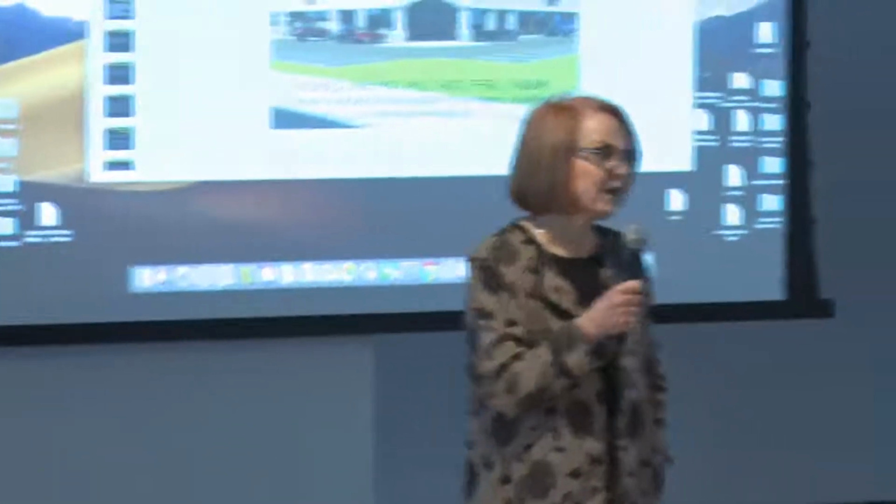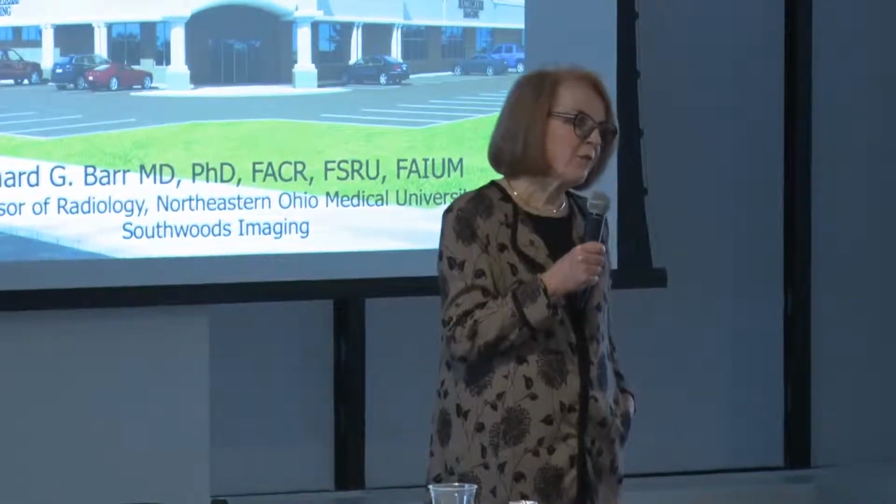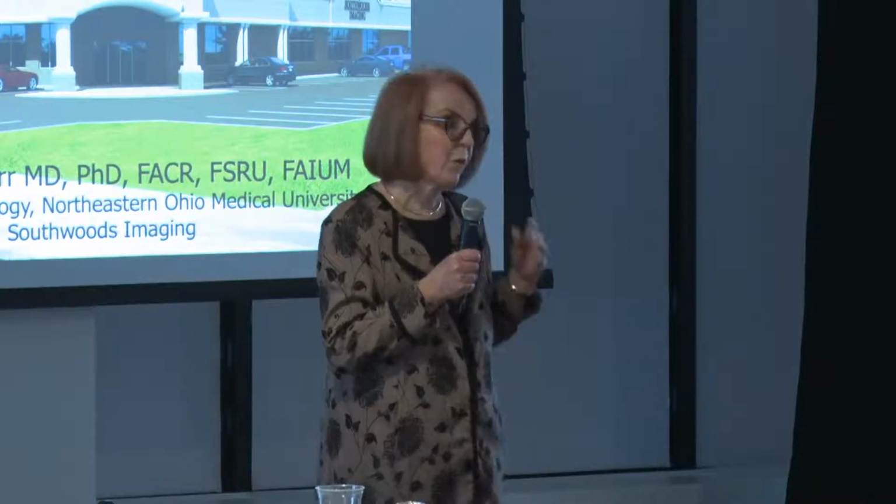How frequently will FNH show stellate vessels? So virtually all, but not all. Virtually always we can see it. And of course, it depends on the quality of your scan and how well you can get the lesion into your field of view. Some of them can be more difficult, of course. There's no question that I do recommend some Primovist, or you call it Eovist, MR scans, but they're infrequent scans for sure. It's very, very good.